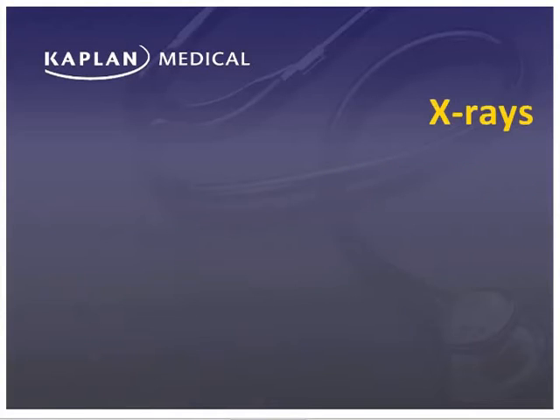Without a doubt, X-ray is by far the most commonly ordered imaging study, and this is reflected on the exam with the presence of lots of X-ray images accompanying the question stems. Knowledge and understanding of these images is guaranteed to help you correctly answer many questions on Step 2 CK. Let's start by discussing chest X-rays.